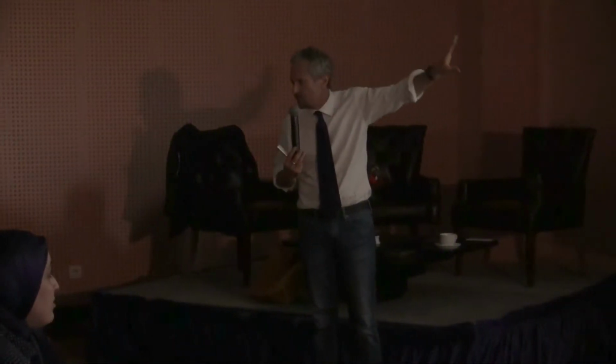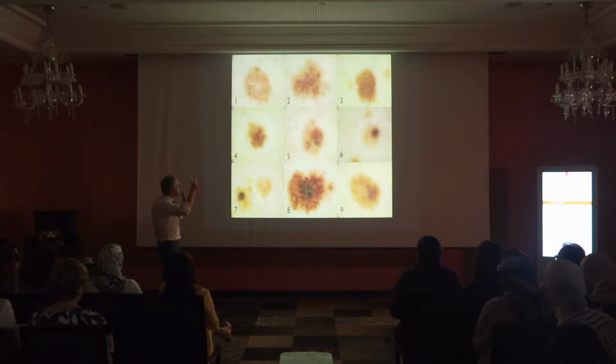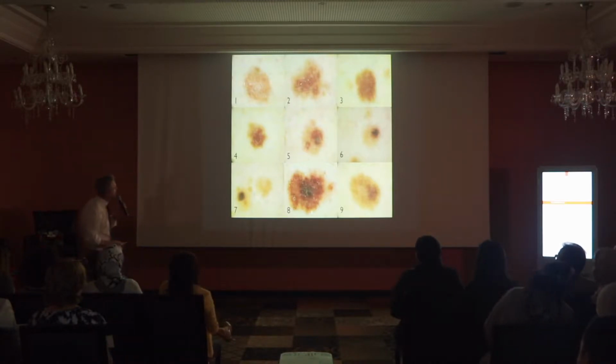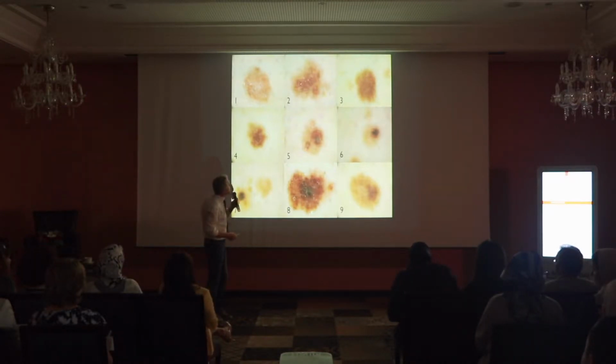These belong to one patient. So if you find something to remove, write down the number, or 0 if you don't like to remove anything. A patient with multiple nevi, you have to compare.